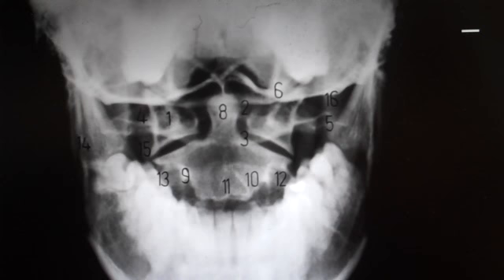Number 12 and 13, we see that when you drop down from the top surface of C2, it kind of goes out like this. That is the transverse process of C2. And right here, right beside of the number 2, it's dark again. That's the TP foramen. So number 12 is labeling the transverse process, and number 13 is labeling the TP foramen.